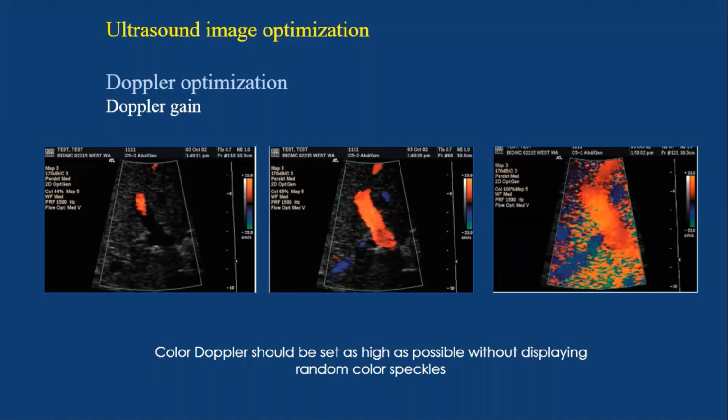If you want to start scanning an upper arterial study, you should go to the settings on the machine and choose upper arterial duplex or lower, as you like to start with, because the machine should automatically adjust all the variables that you will need during the scan. Only a few manipulations will be required from you during the scan after choosing the preset.